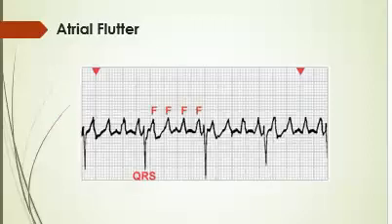So here we are. You can actually see where the QRS is. And I just want to point this out, guys, because I didn't even realize this when I was putting this together. This is in a different lead than I've been showing you. I've been pretty much showing you everything in lead 2 where all the waves go up. If you look at the QRS here, they actually go down.